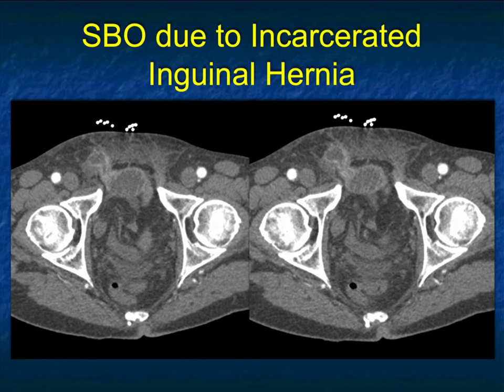We mentioned hernias. One of the causes of small bowel obstruction is hernias. Hernias can occur for many reasons. The classic one is an inguinal hernia. We talk about incisional hernias. We talk about internal hernias like lesser sac, but we're going to talk about the hernias that typically go through spaces like the inguinal region, or through muscle defects, or through post-surgical scars.